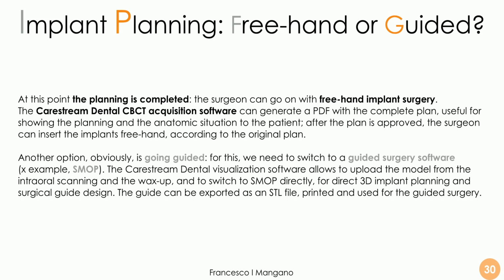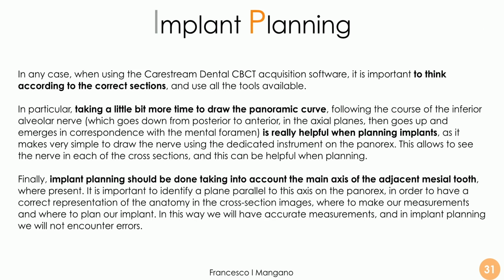upload inside the SMOP. All this set of images, all this set of 3D data are imported automatically inside the SMOP software in order to proceed with the planning directly and for the design of the guide. And the implant planning is in this case very easy with the guided surgery software. We will talk about guided surgery software more in detail in the next lecture.